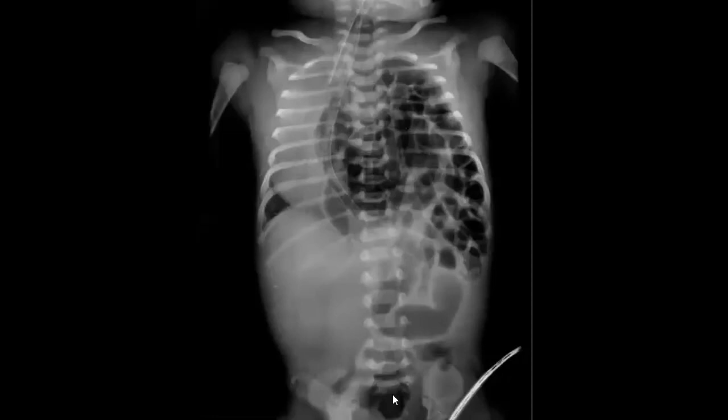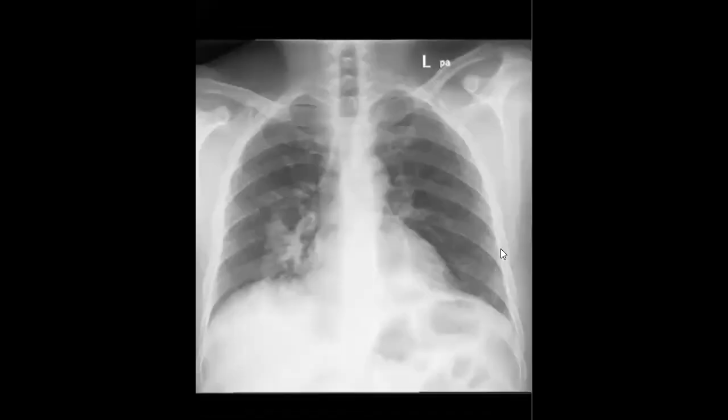Umbilical. So this is what is called the diaphragmatic hernia on the left side. Can be Bochdalek. Okay, Muhammad. Yes, Amani. Perfect. I understand that you write in English.